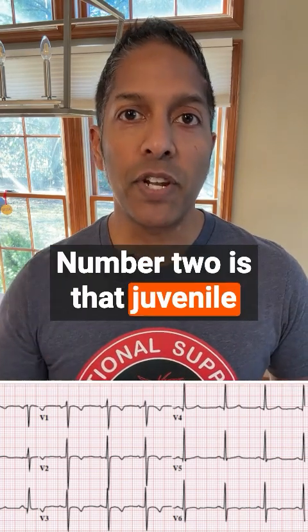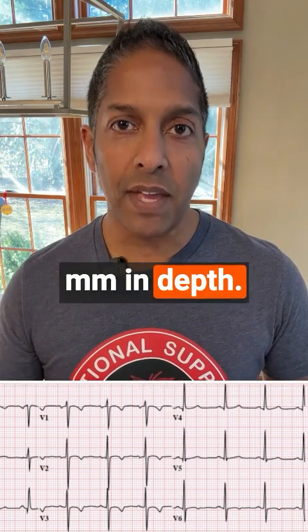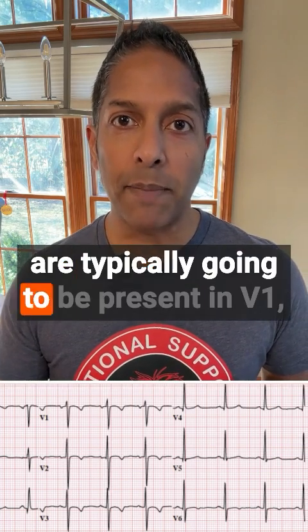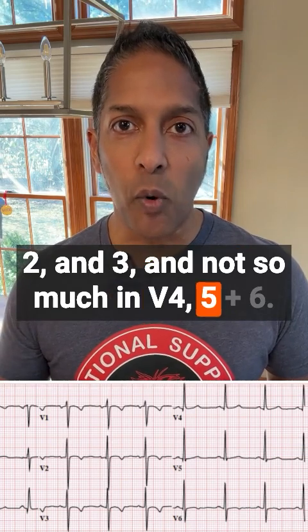Number two is that juvenile T-wave inversions are usually 3 millimeters or less in depth. And then finally, number three is that persistent juvenile T-waves are typically going to be present in V1, 2, and 3, and not so much in V4, 5, and 6.